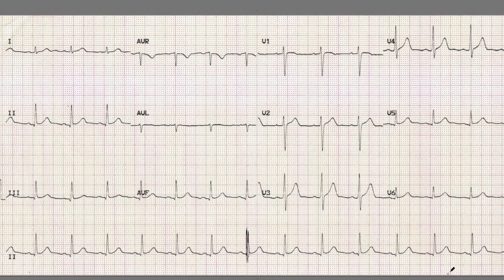So the ones behind should line up with the ones ahead roughly, because remember that there is a bit of variation with respiration in terms of heartbeat. Another way you could look at that is count the number of squares, or take a ruler and measure the difference between each of these QRS complexes and then see if they match up. So rhythm is reasonably straightforward.